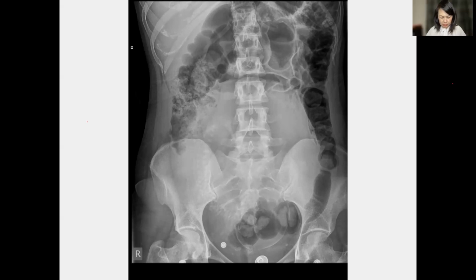Intussusception. Intussusception, not in this case. Rib fracture, no, that is a costochondral calcification. All this is not fracture. It's already at the anterior ribs, so that's normal. Some said toxic colitis. Toxic colitis, no. A bit prominent, okay. Okay, so I give you all the answer.